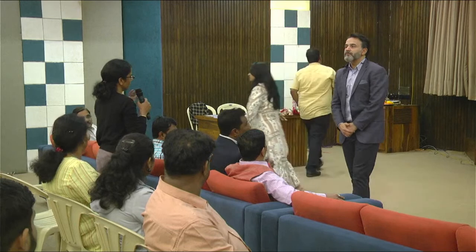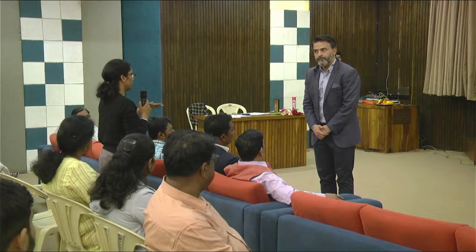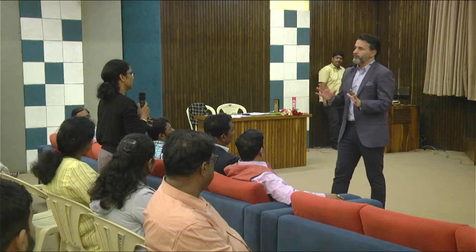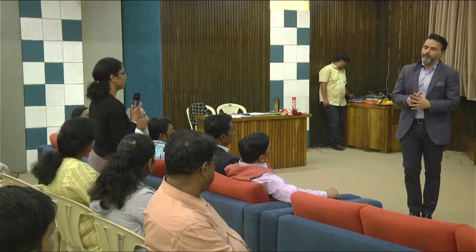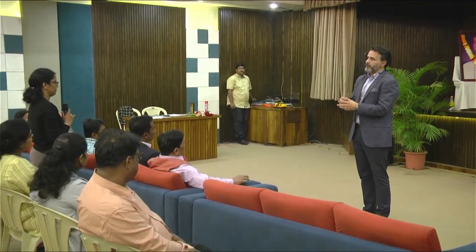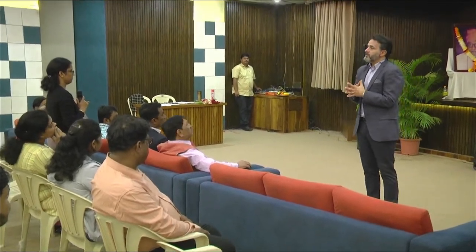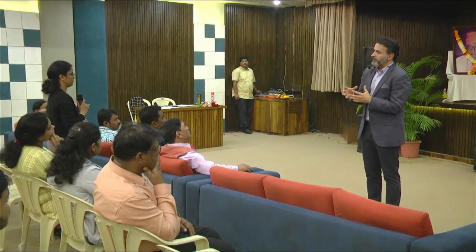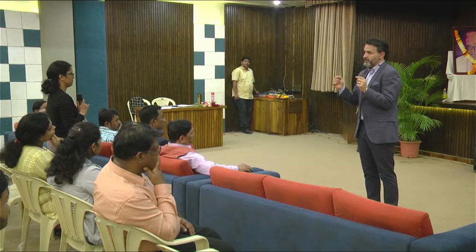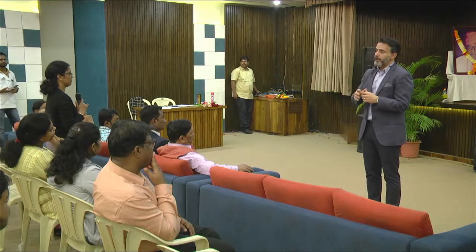Whether the guide is fully at the level of the mucosa, it is guided. It's for the initial pilot drill, fully guided. Yes, totally guided. We need not remove each layer like that. After the pilot drill, we need not remove the first layer. I will show you, but thank you for questioning me about this. Once you get the guide, once you get the sterilization procedure, when you finish it, when you put it in the mouth, if it is not a too retained guide, then you make the fixation first. When you fixate the guide to the upper jaw or the lower jaw, then everything is fully guided.